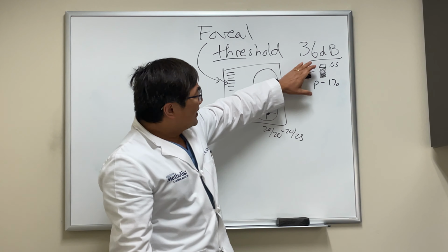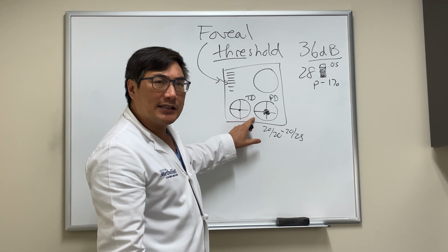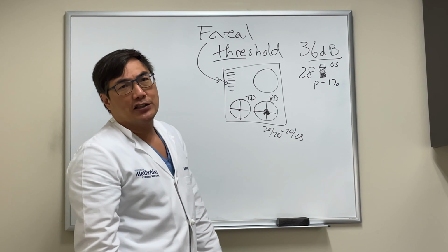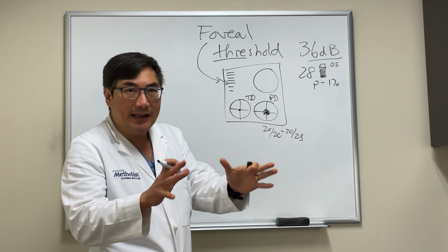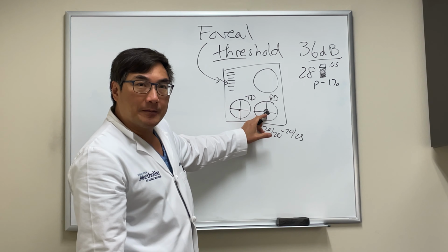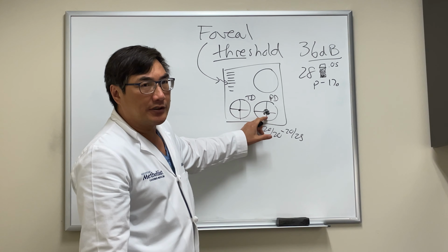What that little gray box means in the legend, which is right here, tells us the chance that that spot, against age-matched controls, is normal. It doesn't tell you that it's abnormal. It just gives the probability, the P, for that spot. And once you have 3 or 4 of them together, and they're all doing the same thing, then you're pretty much convinced that that's a real scotoma.